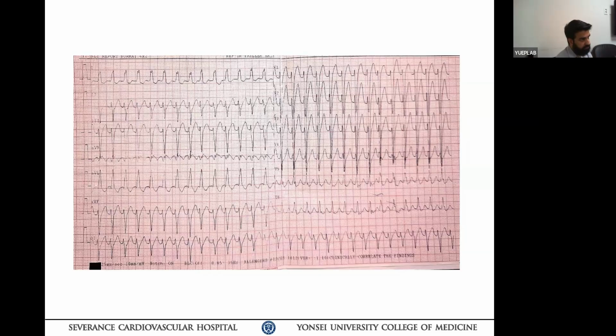So how can you explain the suspicious fusion beats that Oyundari pointed out? Sorry, which one? For example, this one. Do you want to see the baseline? Okay, one more person. Then let's go to the sinus rhythm.